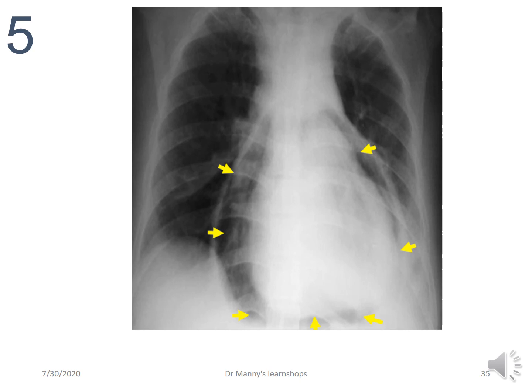Similar, but not similar to a previous one, because it's focusing on the heart. Technically you wouldn't be wrong in saying what it was previously, but we're not going to say that. You've now got air in an area that should be radio-opaque, the heart. So therefore this is an example of pneumopericardium. Air within the pericardial sac. And typically it's not life-threatening. The air will eventually be absorbed.